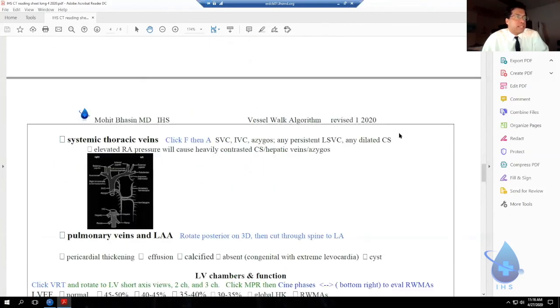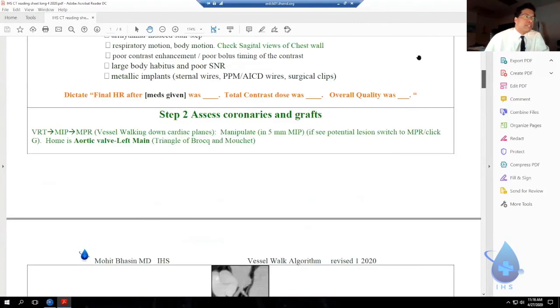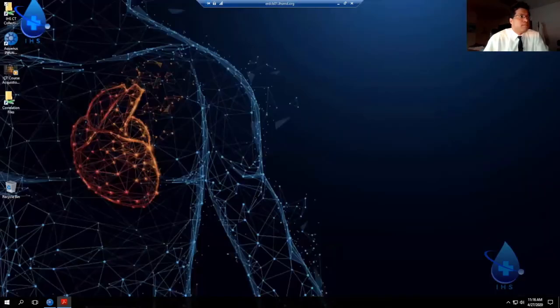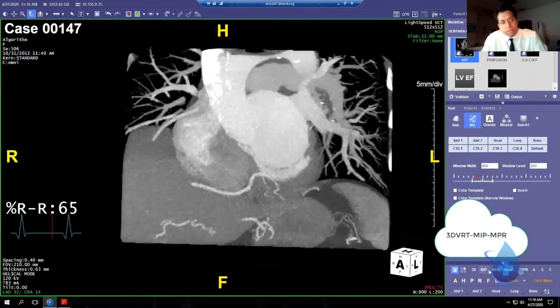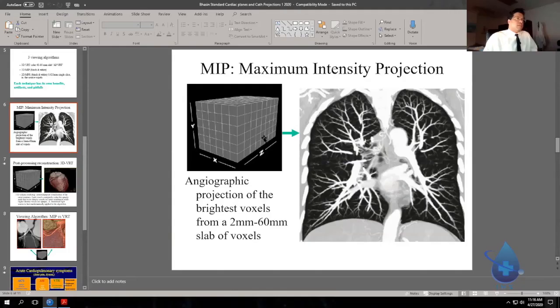We're going to dive into that in a second. But the moves on the mouse, when we start going into those in a few minutes, those are labeled here in blue, okay? And there's 7 of those that I've got to show you. Before I do that, let's talk about what these viewing algorithms mean and do when you click them, okay? When you click that MIP button, the computer goes through every row here and it finds the brightest cube and it pushes only that brightest cube to the image.